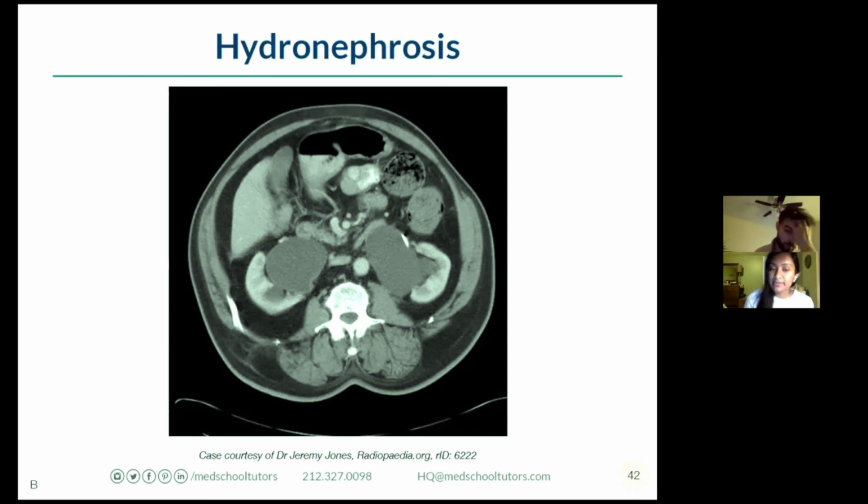No, I think you nailed it. The big thing is really just knowing what normal looks like, and seeing a lot of them over and over again. By this point, we've seen a couple of kidneys, and I urge you to look every time, even if the priority is not the kidney, even if it's a clear pancreatic pseudocyst. Look at the kidneys just to get a sense of what a normal kidney looks like. That way, when you see this, you'll know, okay, this is not a normal kidney. Yeah, absolutely. And behind the vertebrae, those are the paravertebral spinal muscles. Nice. Awesome.